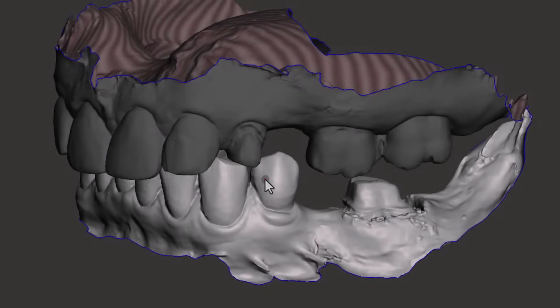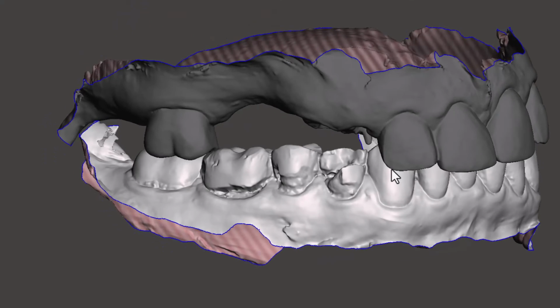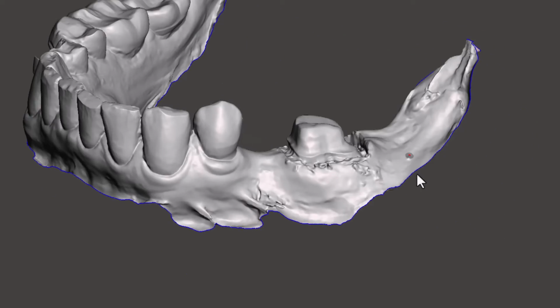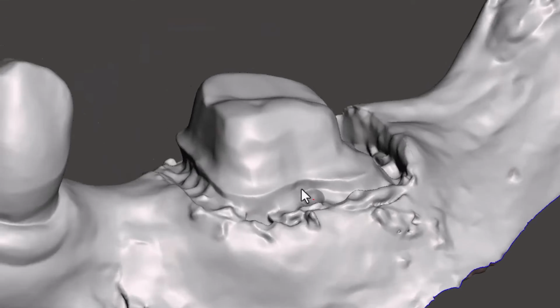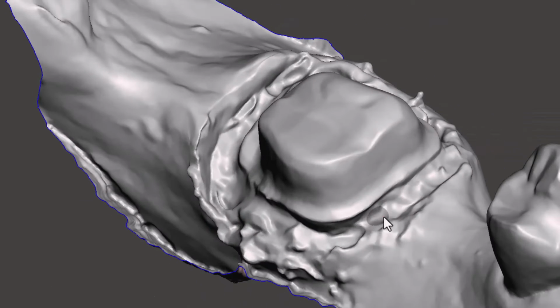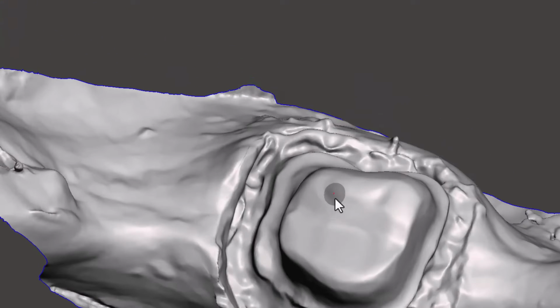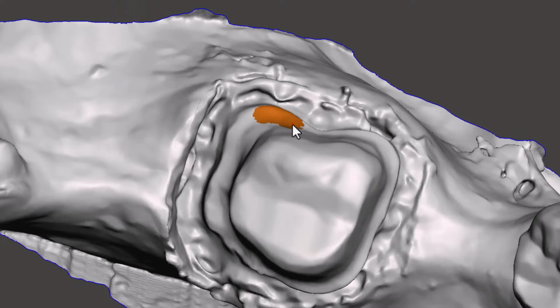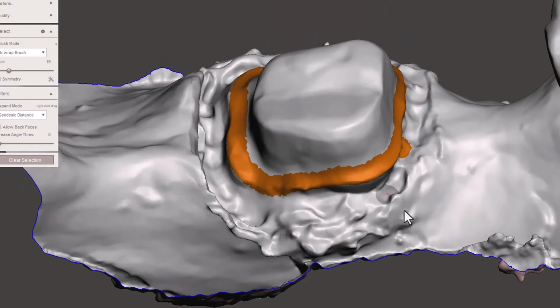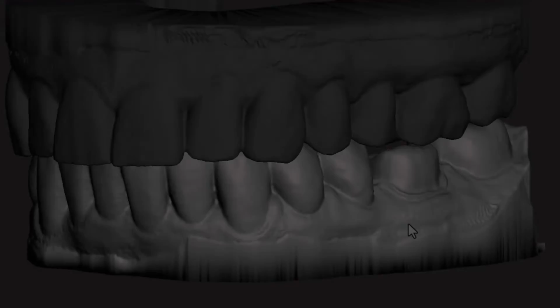These are examples of prep tooth scans accepted by the AI. This example of upper and lower STL files has been exported in bite relation. When we zoom in on the prep tooth, we can see that retraction cord has been used during the scan process, allowing for good capture of data of the prep tooth. The preparation has followed the recommended design specifics for the incisal and occlusal surface, and the margin line is well defined. It is very rounded and not a sharp feather edge or razor's edge.